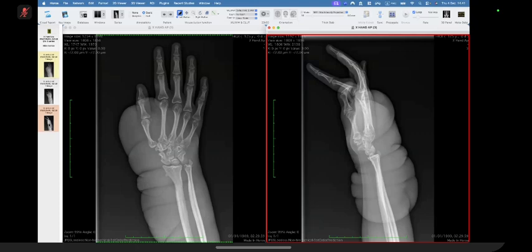It looks actually like the edema due to clearance of the lymph nodes in breast cancer patients. The other possibility, filariasis, also can give unilateral limb soft tissue swelling and edema. However, it's more common in the leg. You mean elephant leg? Elephant leg. Yeah, I didn't see it before in the hand.